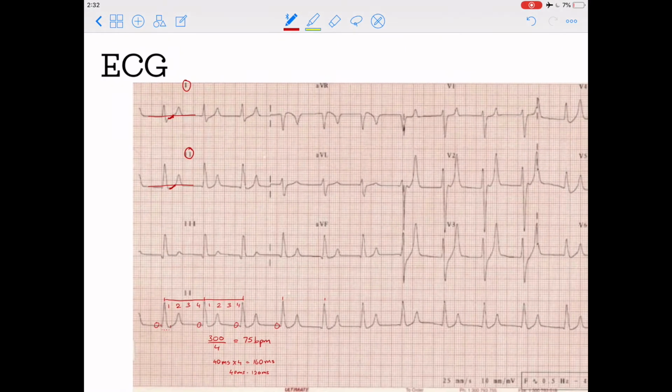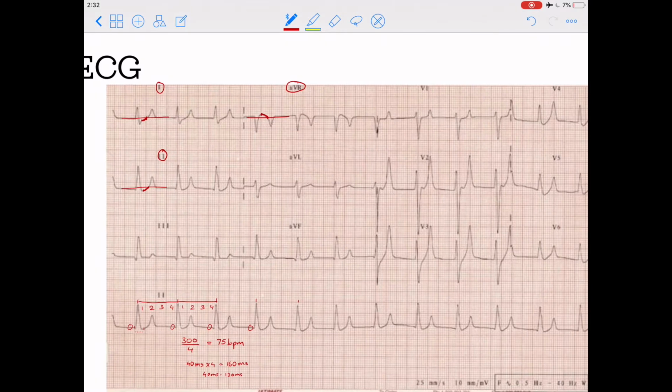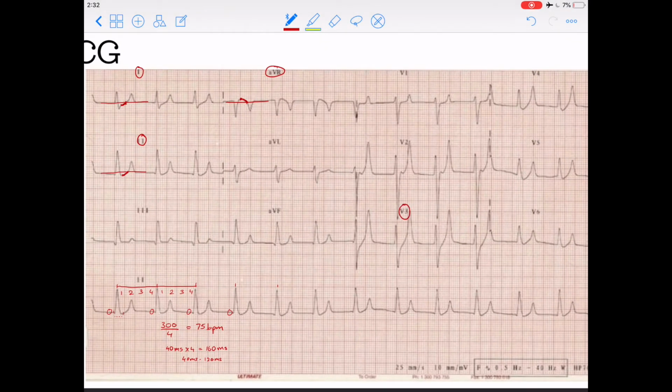Okay, so there's also an ST segment depression in AVR. Here, it's interesting because the ECG waveform has been reversed, and that's because the electrical activity is flowing in the opposite direction. So we see that the ECG wave here has been inverted. We'll draw the isoelectric line, and so that's the end of the S wave, beginning of T, and we see that if this were inverted, that would fall underneath the isoelectric line. So there is an ST segment depression in lead AVR as well. And it's the same case in V3, V4, V5, and V6.